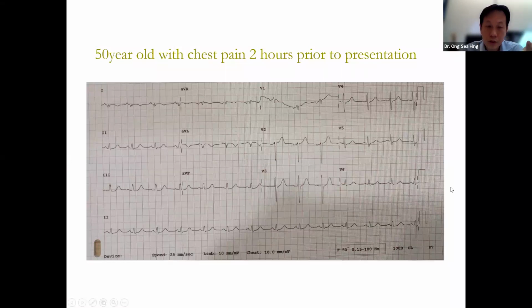the A&E doctor saw this ECG and said it's a normal ECG. But if you look carefully at this ECG, there are a few clues that you shouldn't send this patient home. Okay.